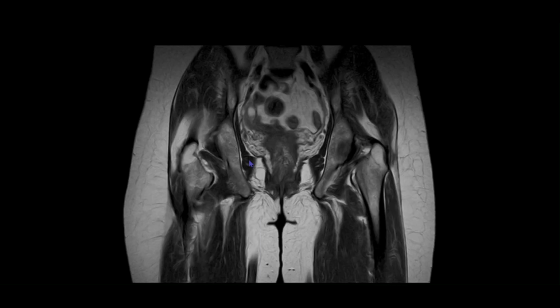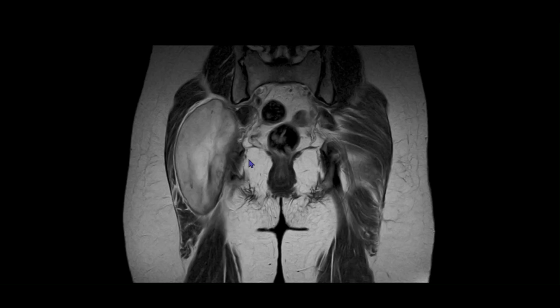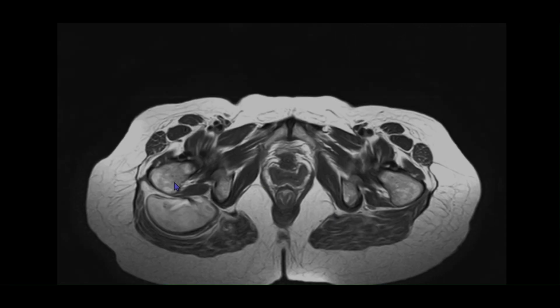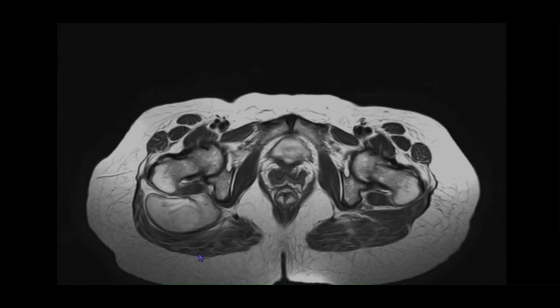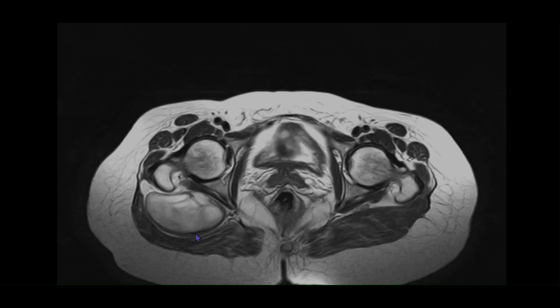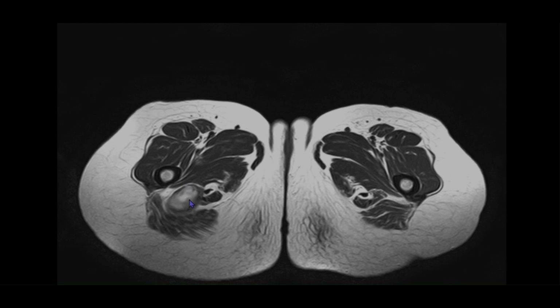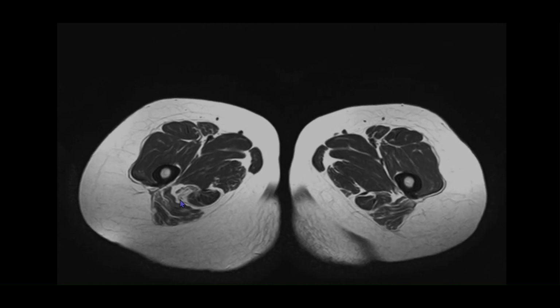The signs that are helpful for showing us a nerve sheath tumor are the target sign, the central hypointense area and the peripheral hyperintense appearance. This peripheral hyperintense appearance is because of the myxoid component of the tumor, and the hypointense area is because of the fibrous nature. Then there is a well demarcated fat plane. This is the split fat sign, and the sign that we see of the nerve root coming out of this lesion is the exiting nerve root sign.